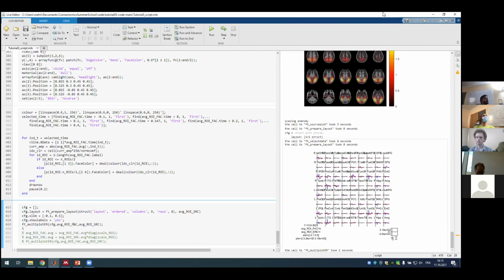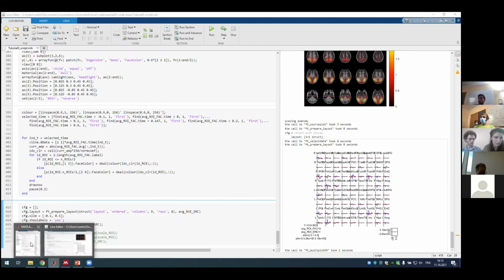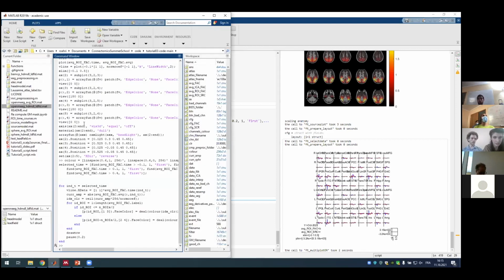Shall we just say that we've shown a live script loading the results that we obtained separately with four separate scripts. So if you want to run it yourself, you should have the scripts in the Git. No, you can pull it from the Git. It's already in the virtual machine. Okay, yeah.